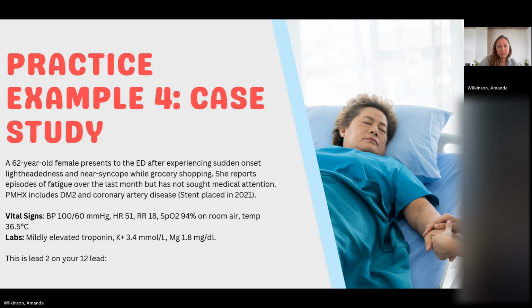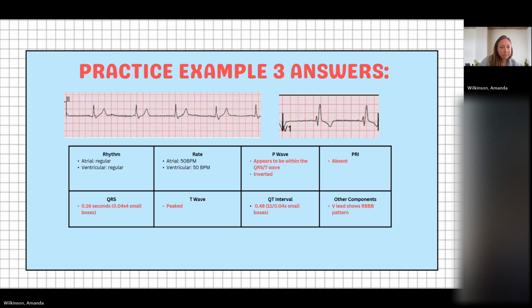Sorry, I have to zoom in on this. Okay. Do you see the little strip? Actually, I have a laser pointer here. It is really blurry on my screen. Okay. Do you see these little, they look like bunny ears, just one ear's a little bit bigger than the other? The lopsided bunny ear.